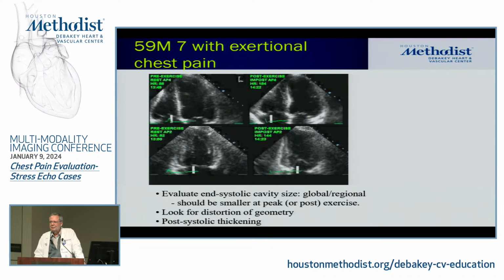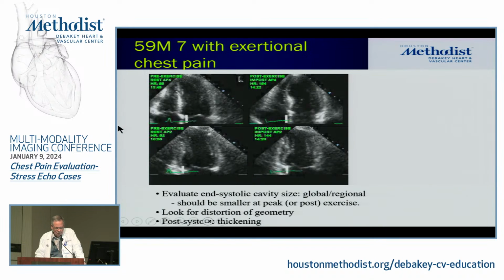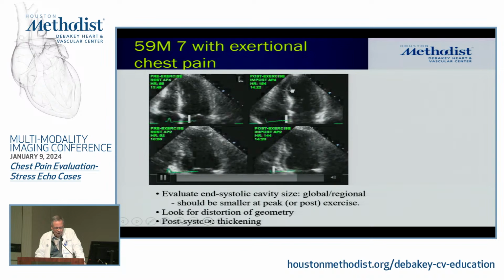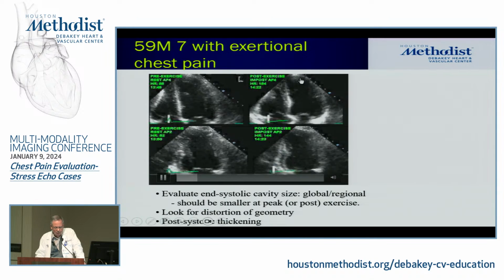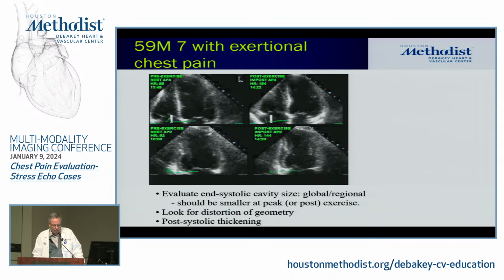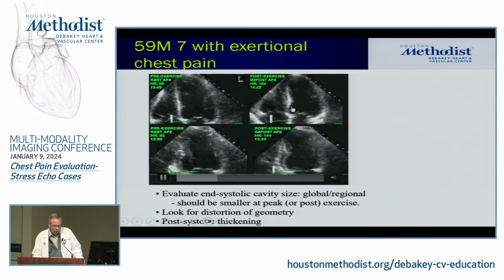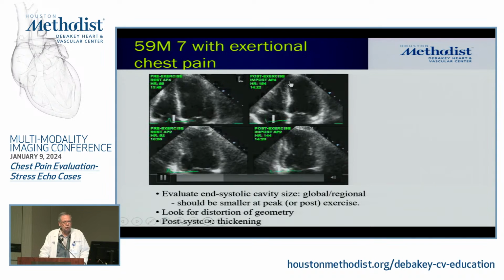Anyone? Does it look normal? I mean, it doesn't look too bad, right? Yeah, so you have this here, okay, but notice when this happens, look at the mitral valve. Now. So this is actually an early diastolic event. This is not a systolic event. So in systole, this contracts well, but then in very early diastole, this area relaxes ahead of the others. It's an incoordinate relaxation, which you see once in a while.